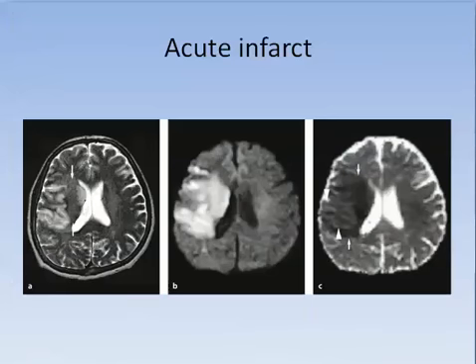An acute infarct is usually showing small penumbra and big core. The core is delineated here, sparing only the medial portion, so the percentage of the penumbra to the core is small to large.